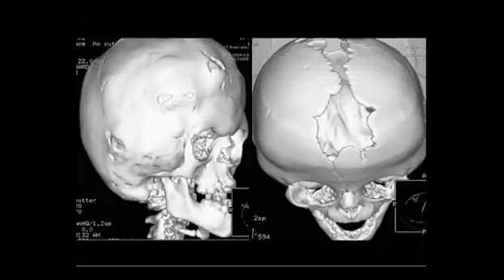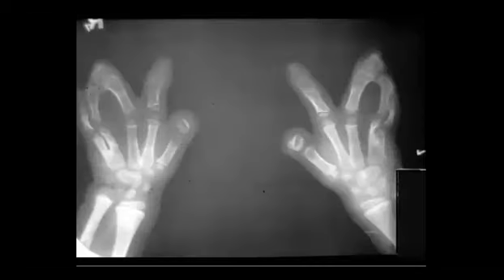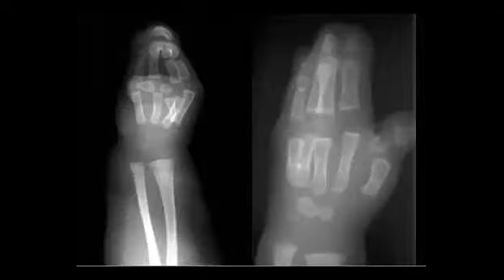This one is a syndrome, deformed tower-shaped head, premature fusion of all cranial sutures, not common, but turricephaly. Apert syndrome, oxycephaly, Apert syndrome, yes, premature fusion of coronal sutures. With syndactyly. Yeah, with syndactyly. Mitten hand deformity.